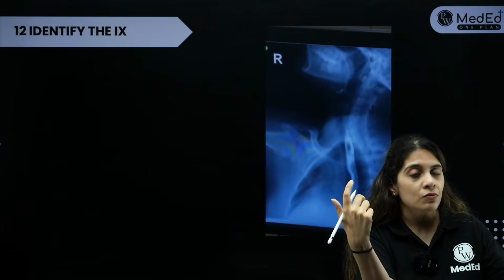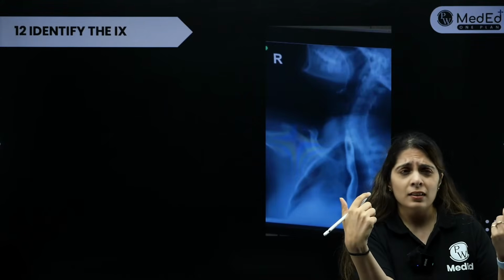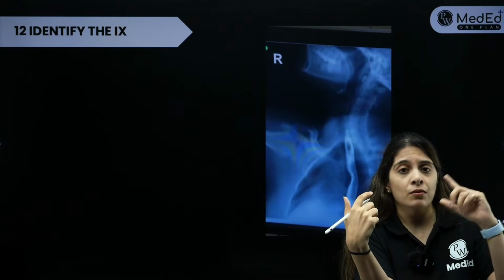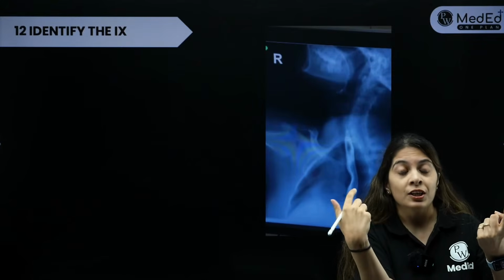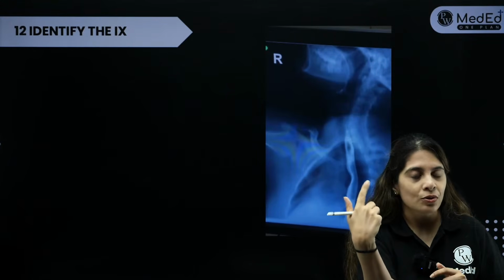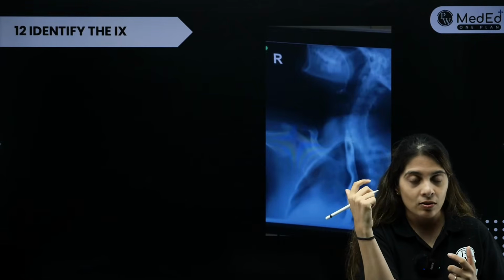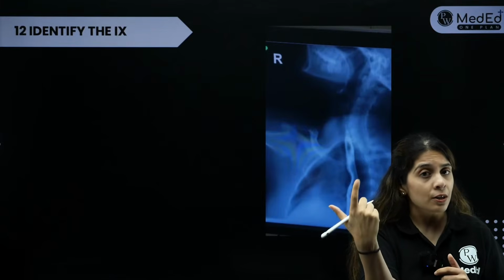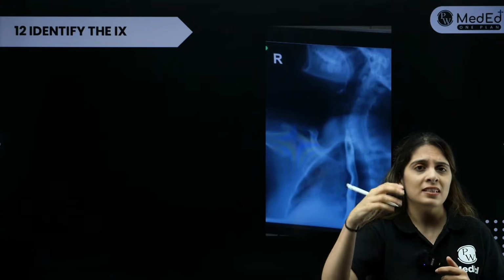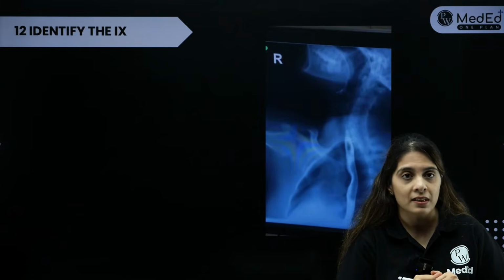The first MCQ which we discussed, the corkscrew appearance, where we discussed the twisting of the duodenum as well as the jejunum, they can show you again in the form of an upper GIT contrast study in cases of midgut volvulus. They can test you for intussusception in the form of a video, in which you will see an abrupt cut-off, a claw sign wherever there is an intussusception.